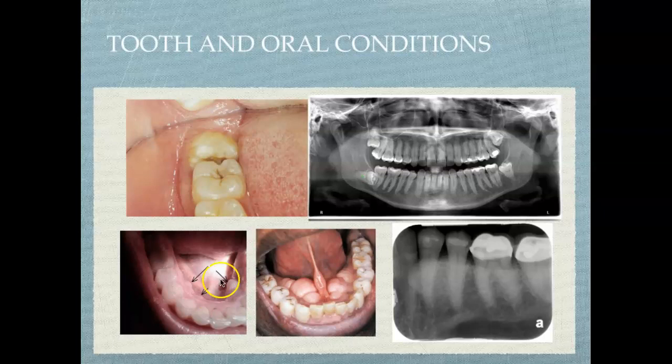I'm only joking because we know as dental assistants taking radiographs that a person that has mandibular tori is very challenging to take a radiograph.